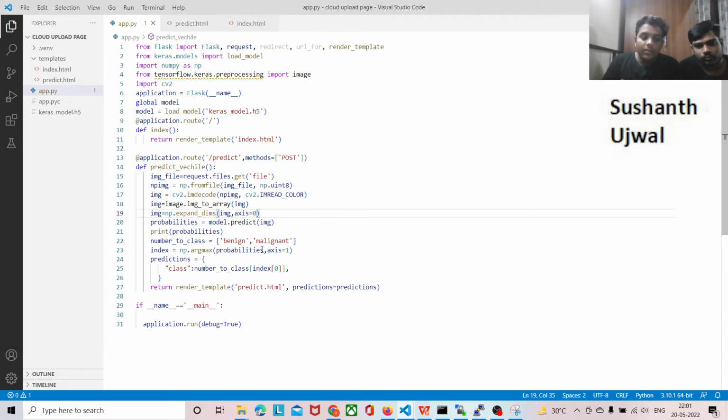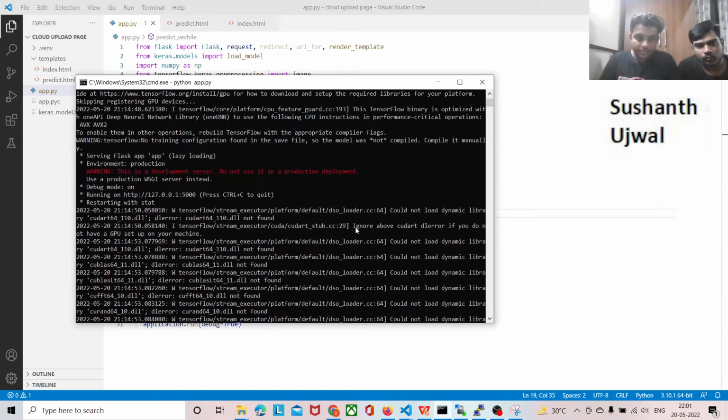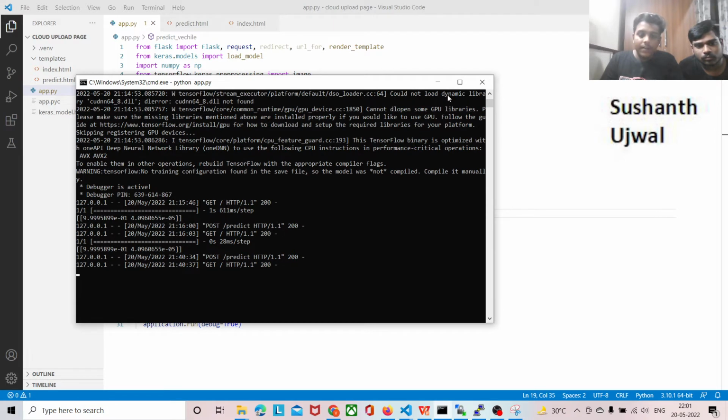By running this, we can create an interface to upload. Now I am going to run this file. Yeah, it is running already.